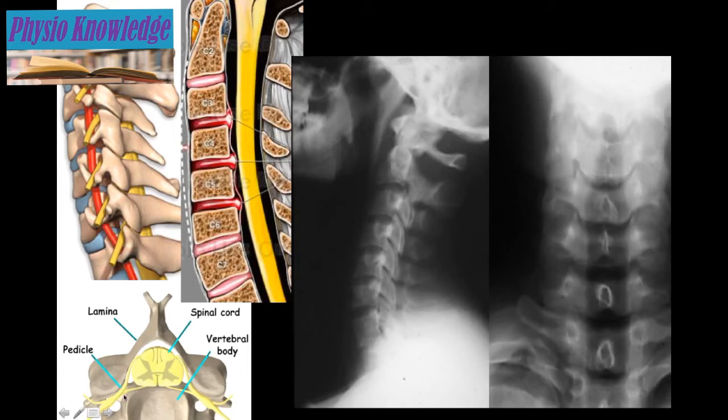We have the pedicle, which is underneath the nerve root here. That would be the pedicle. And when a patient receives hardware fixation, usually the screws are called transpedicular because they cross through the pedicle. You can think of the pedicle as a safe place to traverse the spine in order to reach the vertebral body. So those are the main components that you should be aware of.